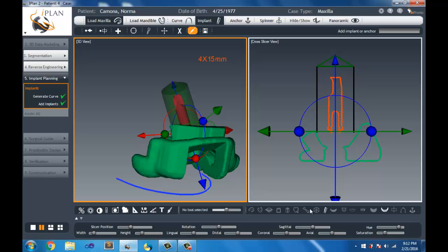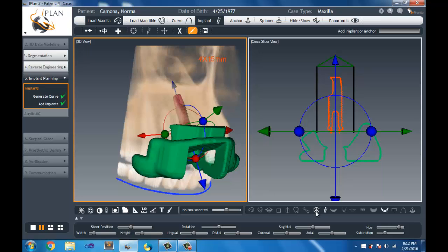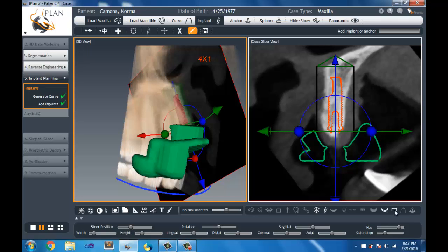So you'll use a 2mm drill, use the osteotomes, pack some more bone in there, and then drop the implant in there, and this will be done. This should conclude the treatment plan for this case.